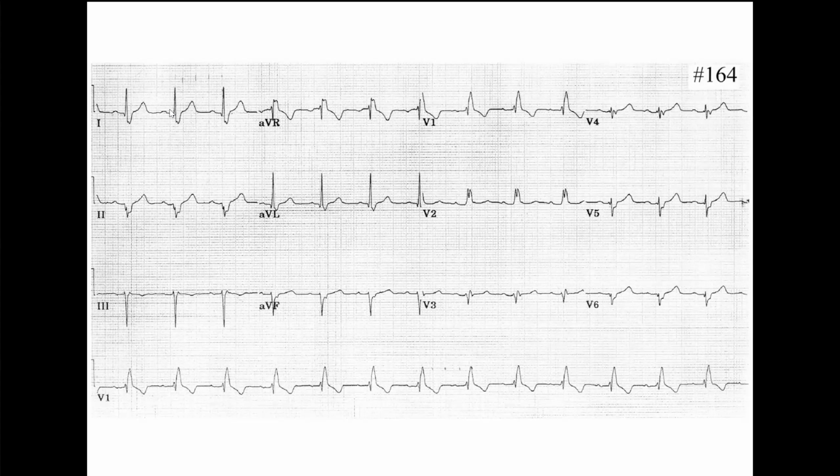Now, next one, the width of the QRS. Narrow. This is narrow. Count it. No, but you can count it in V1 as well. It's wide QRS. You do have a wide QRS. Okay, go on.